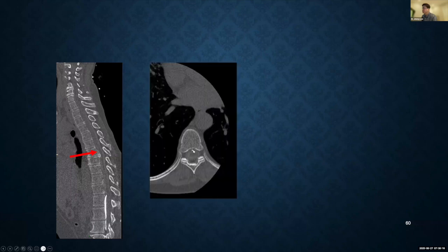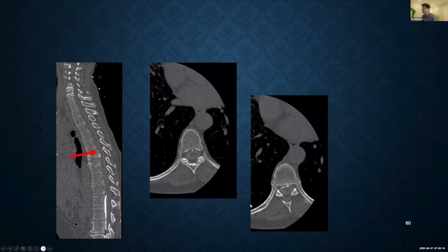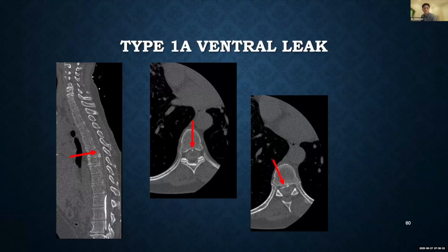Had a CT done, a CT myelogram, and there's a disc osteophyte complex there with a small leak. This is actually not a leakage, it's very dense contrast. And on the axial, you can see that it's intrathecal. On this level, though, you can see that there's epidural collection.